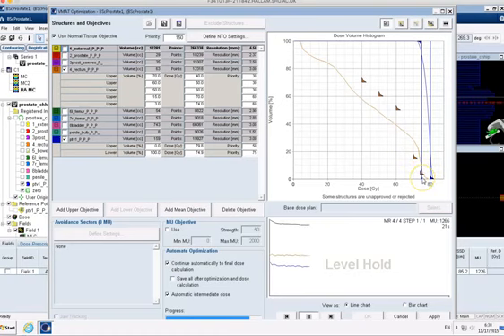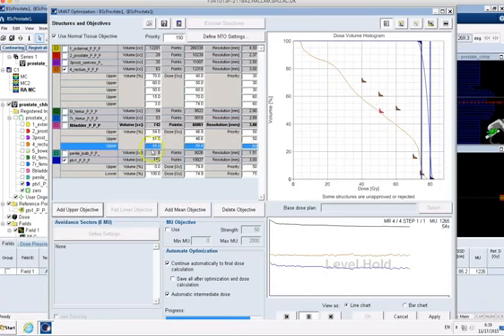So what I would do is have a go at maybe upping the priorities on these further, and saying that it's much more important to reach that. So it's very much an iterative process. And what I'm going to do now is just hit pause on here a second, and I'm going to add my bladder. Okay, so if we look at our tolerances again on our protocol, we can see that we've got 3 tolerances for the bladder. So I'm going to click there and I'm going to go add upper 1, 2, 3, and my tolerance for the bladder V50 is 50%.